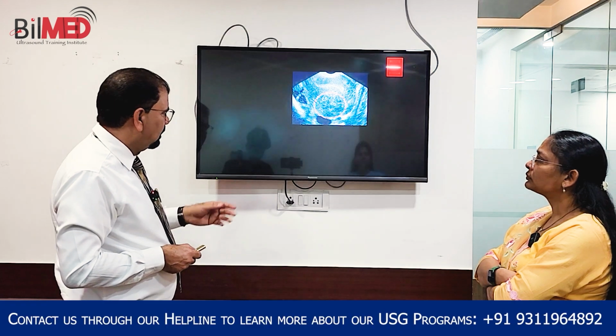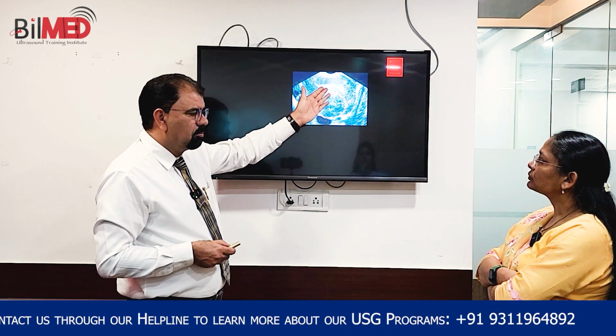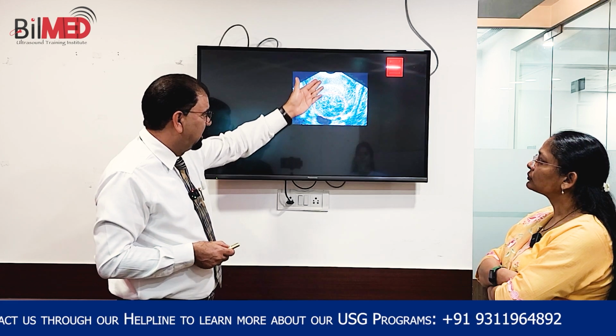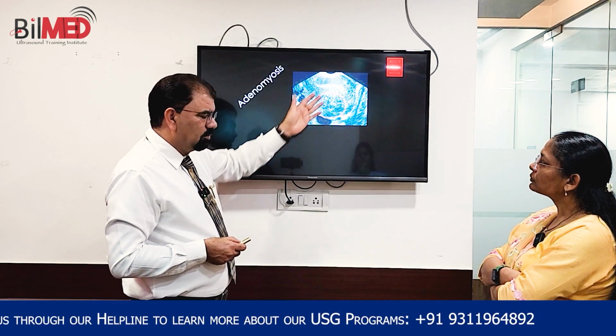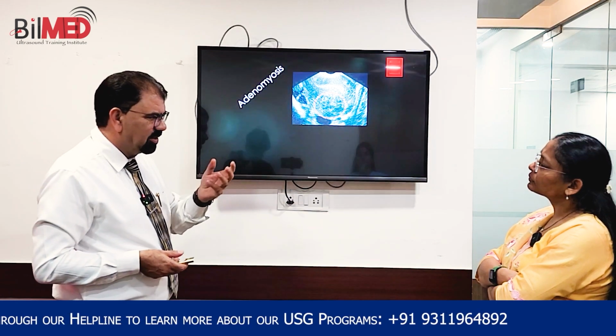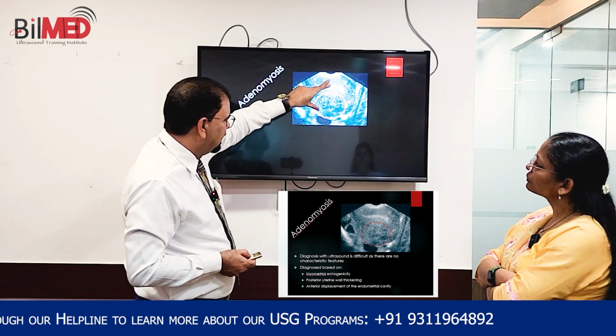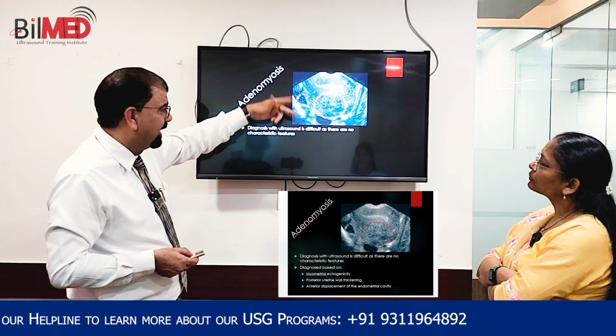And books are writing that I am having a discrepancy between the anterior and posterior wall. Why so? Because I just told you that we will be having multiple small patches, and these multiple small patches are usually in the posterior wall, making it look thicker than the anterior wall.